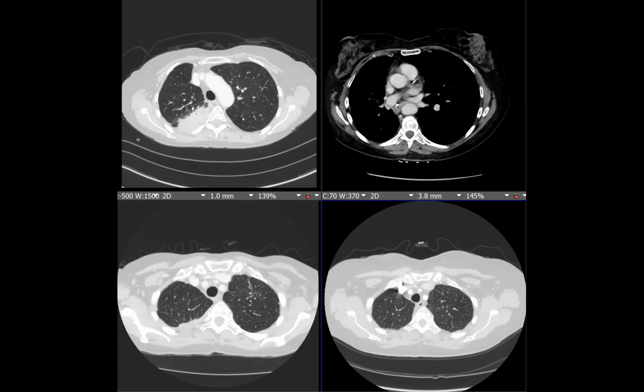Wow, that's really dramatic. So the kidney issues are not vascular? Aarti, I have a question. I was actually going to ask Ben, or whoever wrote into the chat, if they could expand upon the kidney issues. I somehow thought that the kidneys were these lymphoplasmacytic infiltrates, like IgG4 deposits. I've seen rounded little hypoenhancing masses in the kidneys. But what is the nephritis part, or interstitial nephritis part?